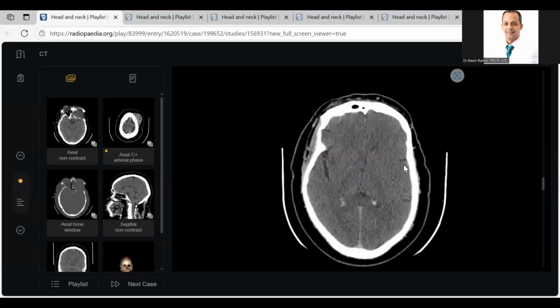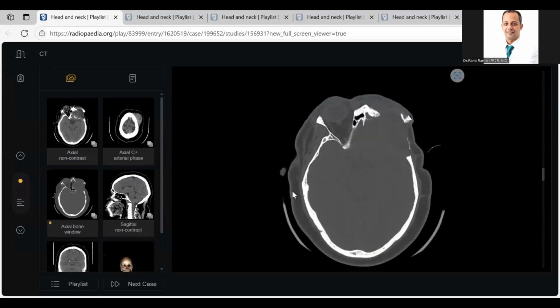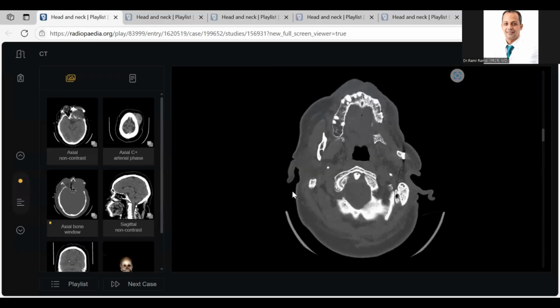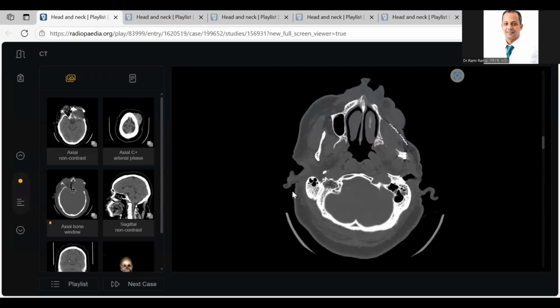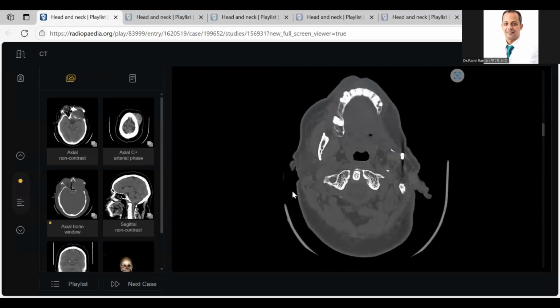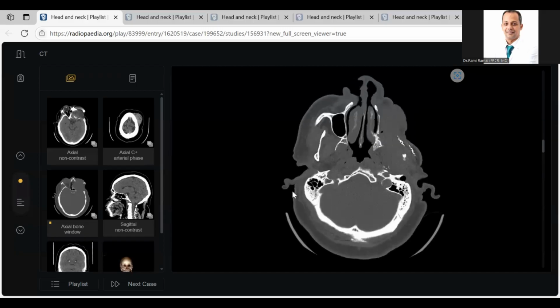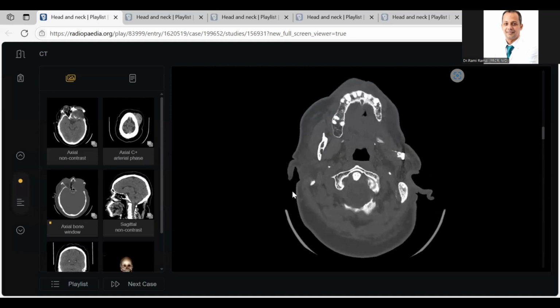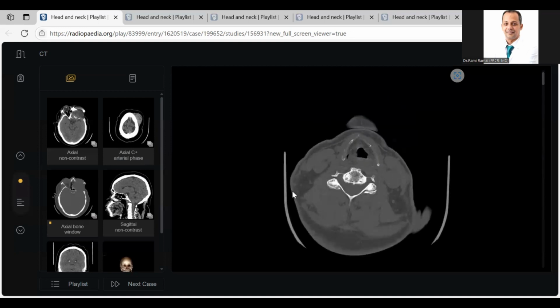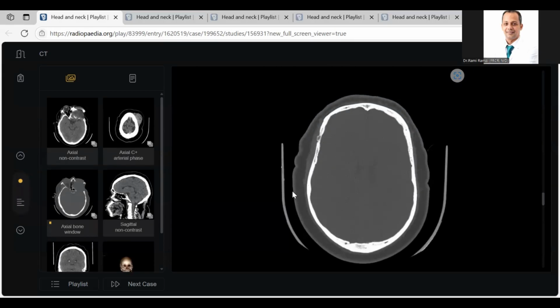Status post. Can I see the bone window? No periosteal reaction. This is status post. I am thinking, with this extensive lesion including the mandible, maxilla and extension to the orbit, of a possible previous sarcoma. Right now the lesion is predominantly hypodense, especially in the orbital part. What about the new finding?